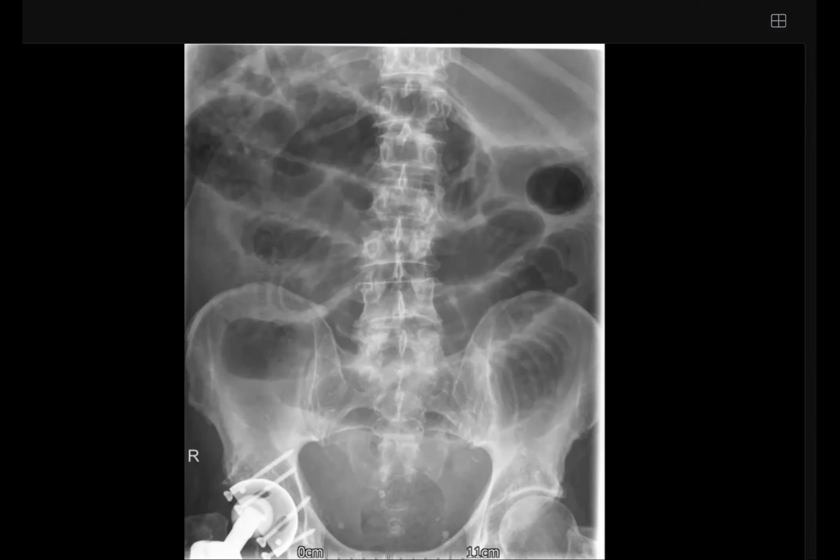Abdominal pain. What do you see? I've been presented with an X-ray abdomen of a skeletally mature patient. At first glance, I can appreciate there is gross, centrally placed bowel wall dilatation. In a few of them, I can see complete valvulae conniventes, making it a small bowel obstruction, which is placed centrally.